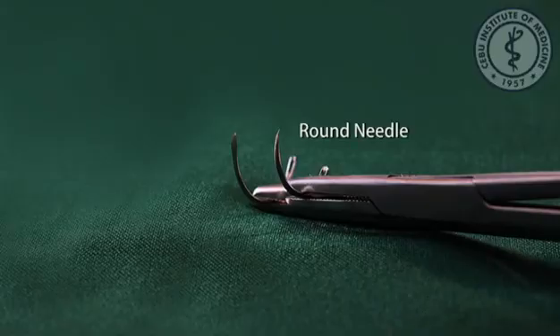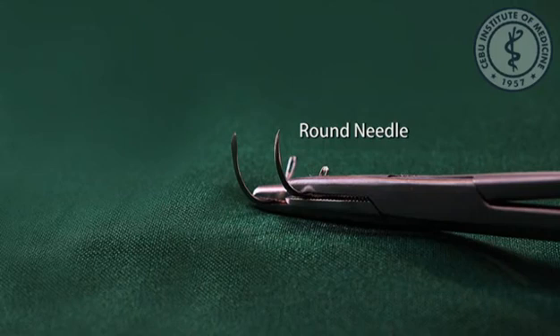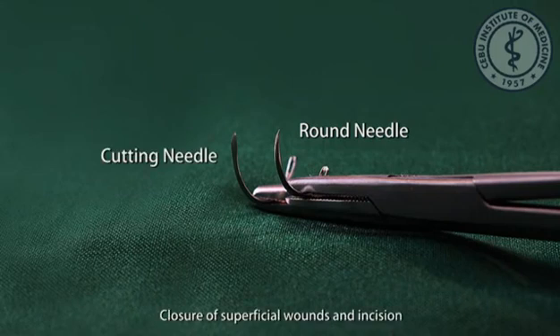Round needle, used for penetrating friable parenchymal and vascular tissues like the liver, spleen, and kidneys. Cutting needle, for closure of superficial wounds and incisions.